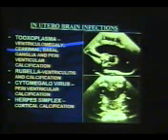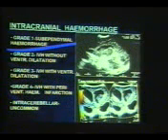Periventricular calcification; herpes simplex, cortical calcification. These are the highly echogenic foci seen in the basal ganglia, and this is toxoplasma where we can see the periventricular calcification.